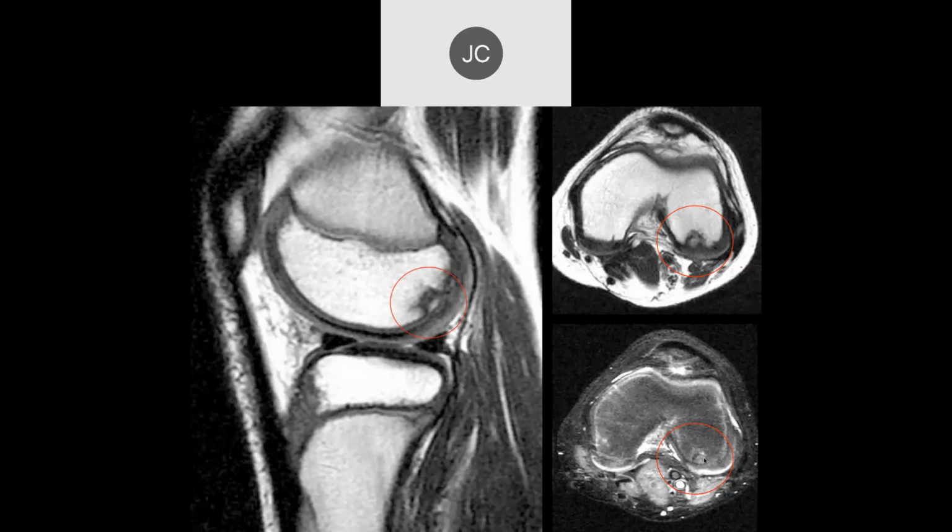It's another osteochondral injury. Here again, the overlying articular cartilage is probably intact, so this may be difficult to see directly at arthroscopy. And this is again a subchondral fracture, and these need to be stabilized.